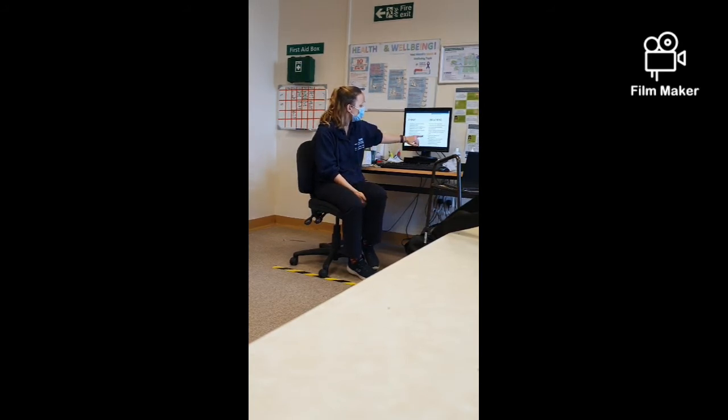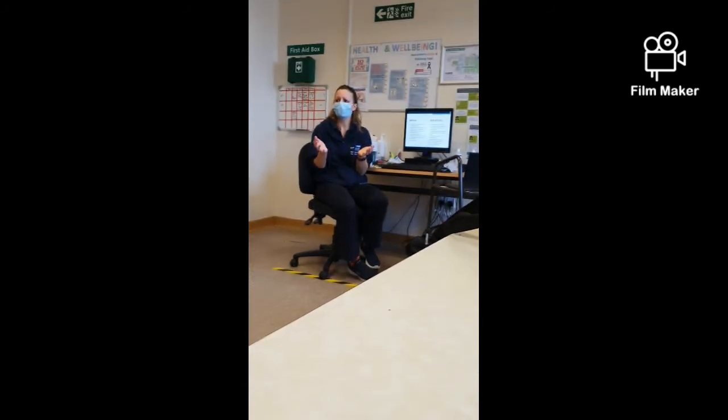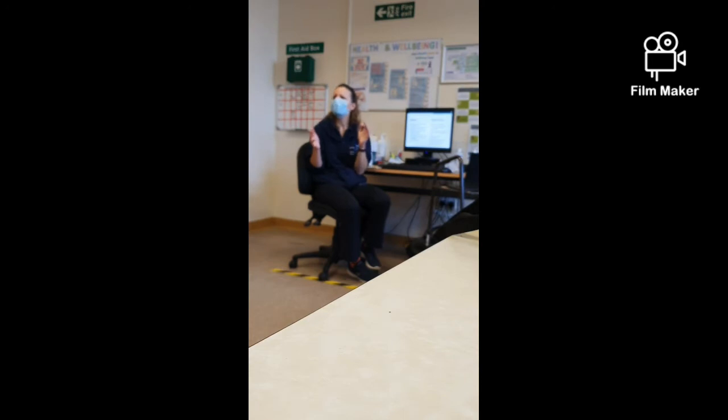And then also we'll just look at the pleura for abnormalities. So you should not be able to see your pleura on a chest x-ray. If you can, then there might be something wrong, and that could be something like cancer, mesothelioma, a tumour. So it's just being aware that if you can see the pleura, we need to investigate that a little bit further.